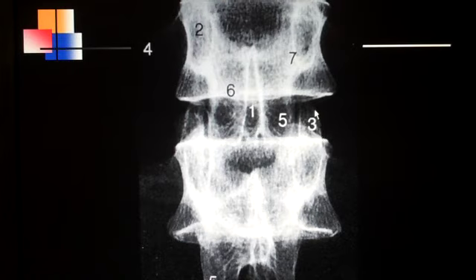Number five is the inferior articular process, the inferior of this segment, and it comes all the way down to right here. And so all of this is the inferior articular process. Number four, all of this is the transverse process. Now the transverse process looks really dark on the screen, but that's because transverse processes do not have a lot of density in the lumbar spine, and so they're just not going to show up very clear on an x-ray because they're huge as far as size and length, but they do not have a lot of density, and so that is the transverse process right there.